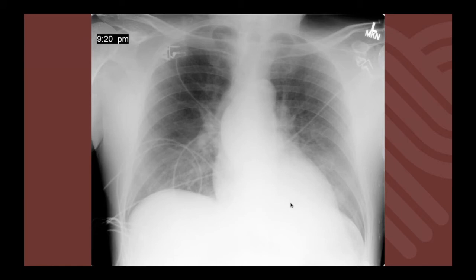He was transferred from an outside institution, a little bit rural area, immediately to the hospital. This is an older case. The patient presented with acute chest pain to the local emergency department, and then they were trying to do a coronary angiography, and the patient just started decompensating, chest pain got worse, and ended up being transferred immediately to the hospital. So I would really appreciate comments here on this portable chest X-ray.